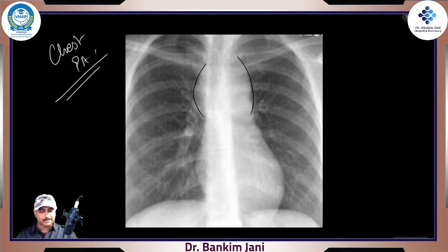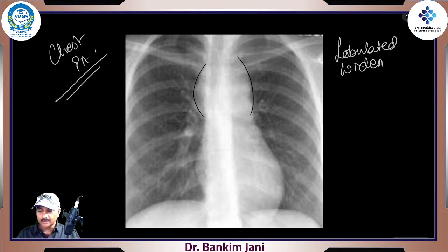This type of bulge we don't see normally. This is definitely lobulated widening of the superior mediastinum, because that's the angle of Louis. So lobulated widening over here.